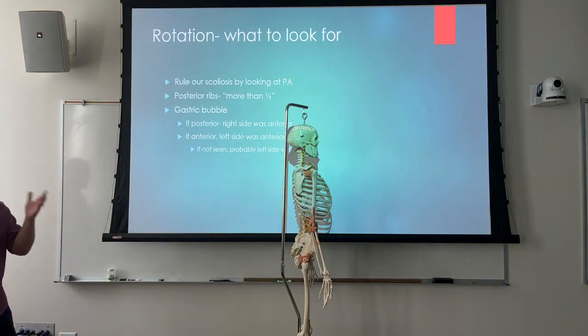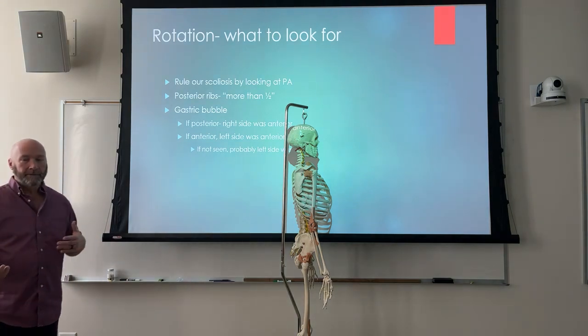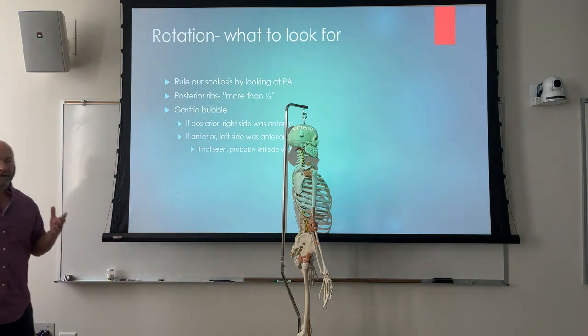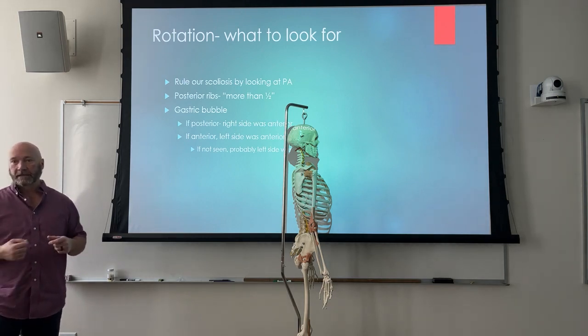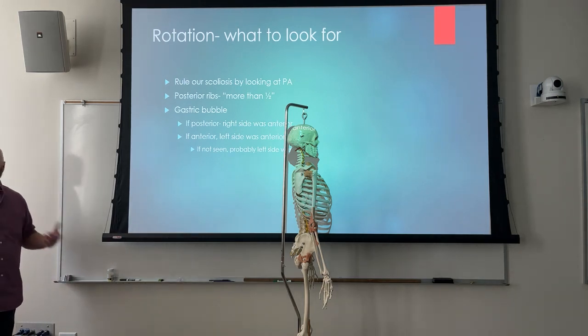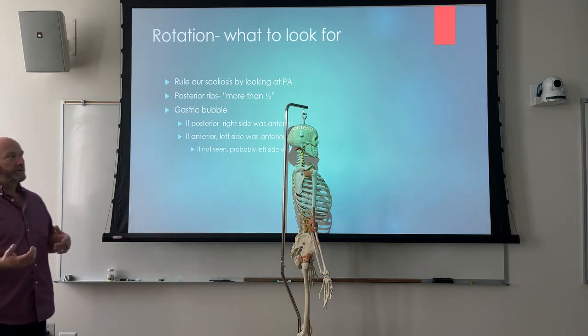You know, if your patient just doesn't look quite right, whenever you position, and it's usually her, so I'm going to say her. It's usually scoliosis, usually in females. So you make your exposure and take a look at your image on your PA before you really assess your lateral. And if you got scoliosis present, you're not going to get an unrotated lateral chest X-ray, no matter what you do. Even if you can get a good PA unrotated, you're not going to get an unrotated lateral. So, don't go blasting the patient over and over again to get rid of rotation on the lateral chest X-ray, scoliotic patient.